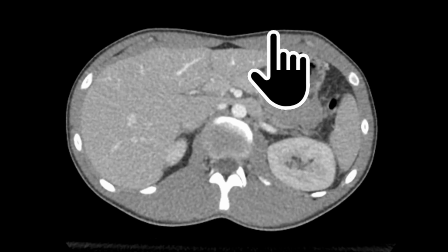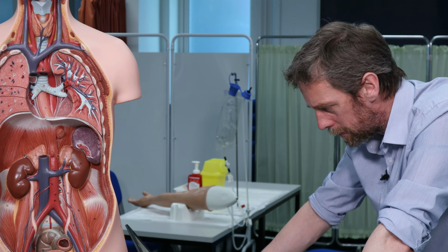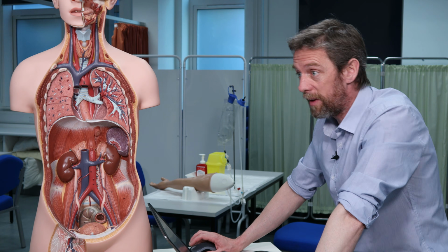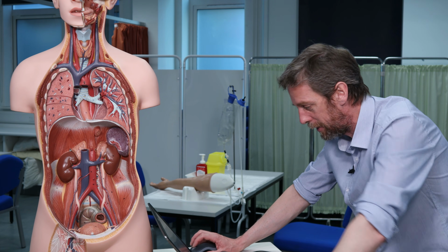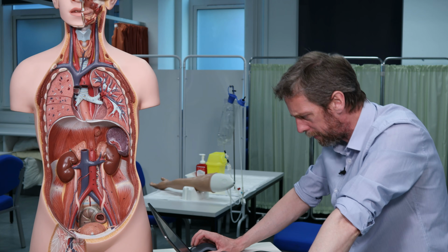So we can also see the abdominal wall very nicely. Pretty good. Right, we've either done better than I expected, or I've just been really enjoying scrolling through this, looking, searching and waffling. Probably the waffling.